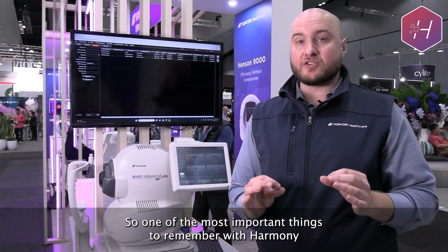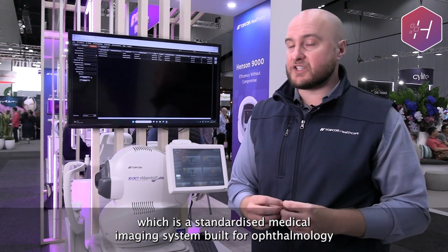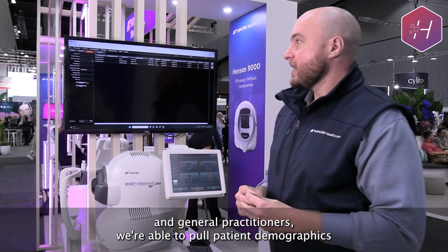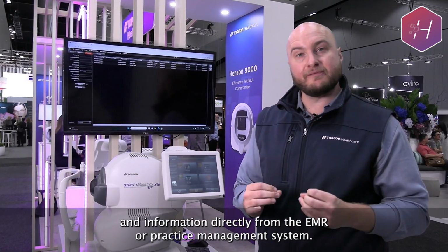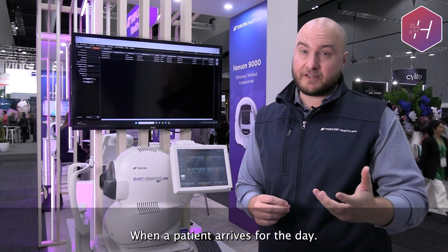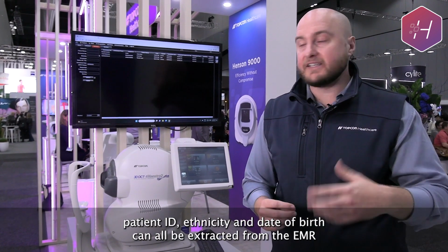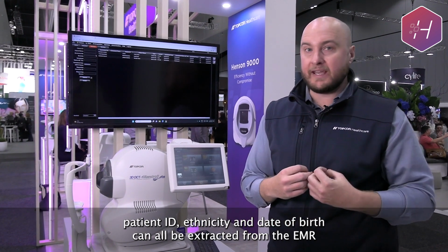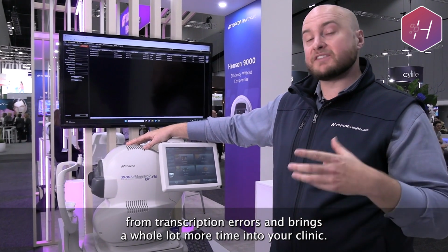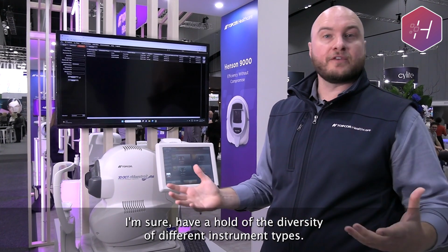One of the things that I touched on briefly earlier was improving our clinical workflow. One of the most important things to remember with Harmony is how we manage patient information. Through the power of DICOM, which is a standardized medical imaging system built for ophthalmology and general practitioners, we're able to pull patient demographics and information directly from the EMR or practice management system. When a patient arrives for the day, their first name, surname, patient ID, ethnicity, and date of birth can all be extracted from the EMR and passed through to the device itself, which saves you from transcription errors and brings a whole lot more time into your clinic.